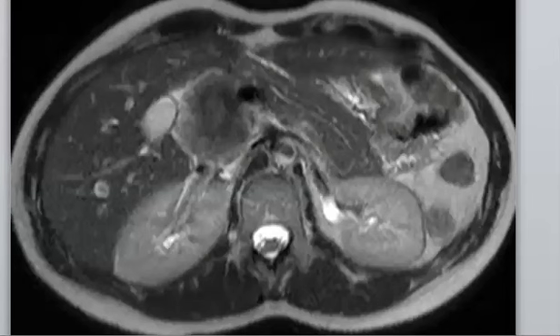This is what is called, when he did ERCP, you find two ducts dilated. This is what's called the double duct sign, which is characteristic, and it is more common to search for what is happening in the head of the pancreas. There's a mass.